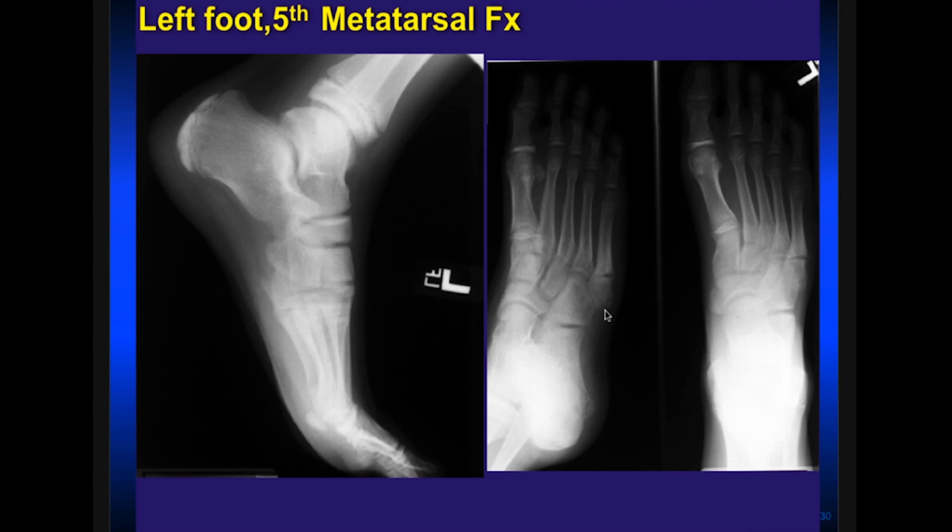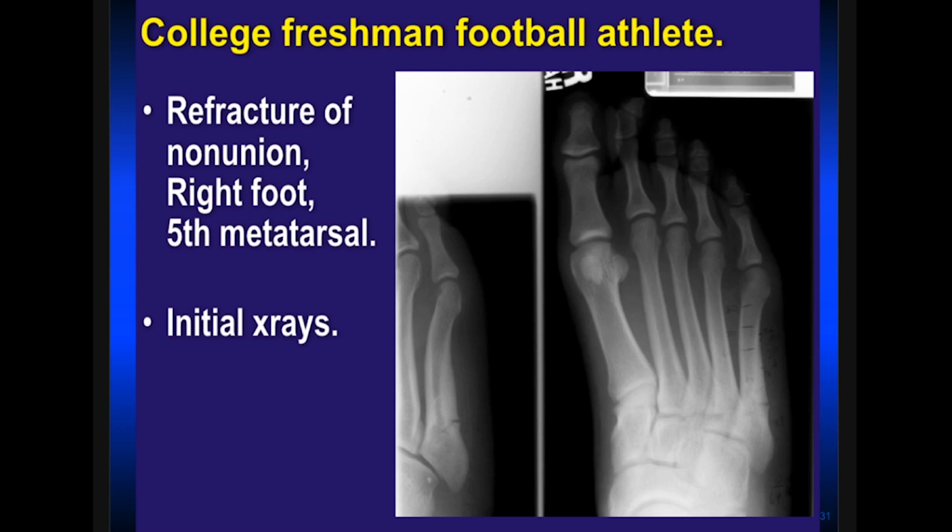You can see here, this is the apophysis of the proximal fifth metatarsal. So that's a normal growth. The apophysis, or an offshoot, where the peroneal brevis is attaching. But here's where his fracture is. So you can see there, it looks like a Jones fracture, but in a 9-year-old, this should heal. Counseled the patient and family that he can't be breaking his casts, and he did heal.